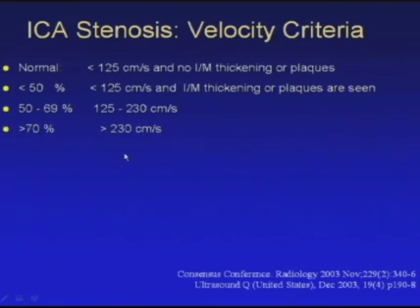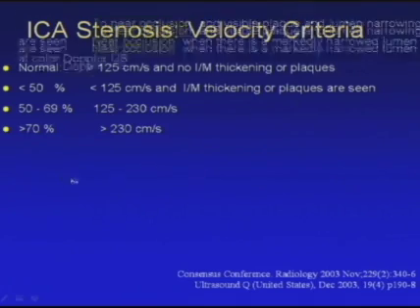When the systolic peak velocity is 230 or more, in this case we have a severe internal carotid artery stenosis, more or equal to 70%.